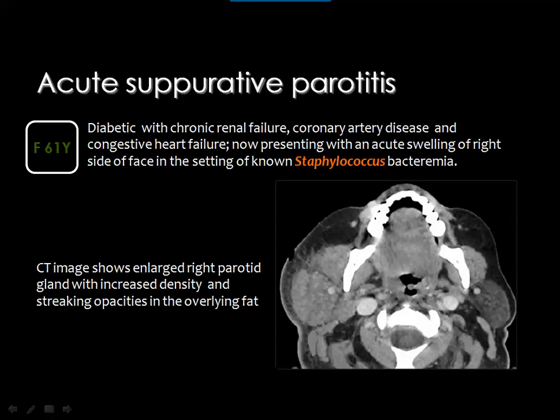And this is also an inflamed right parotid gland compared to the left one. The left is good in size and density. The fat planes overlying the gland are maintained. But here you see that the parotid gland is swollen, it is enhancing, and the subcutaneous fat is stranded.